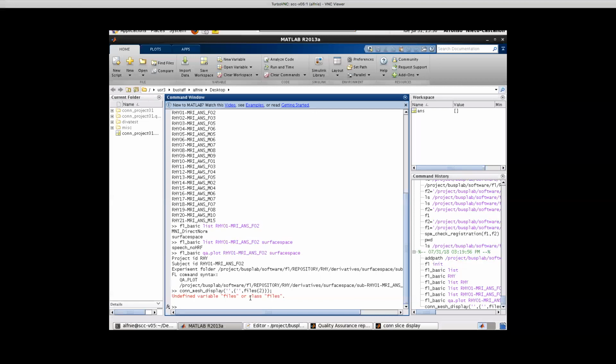And the caveat that I'll just throw in here is that, Alfonso, it'd be absolutely fantastic if all this stuff could just be in these QA plots and we just go through and we see everything. But FreeSurfer has tools that are geared toward loading and viewing these surfaces.